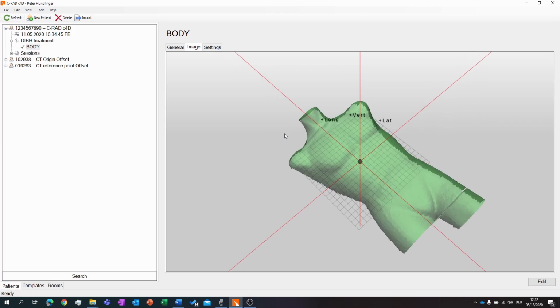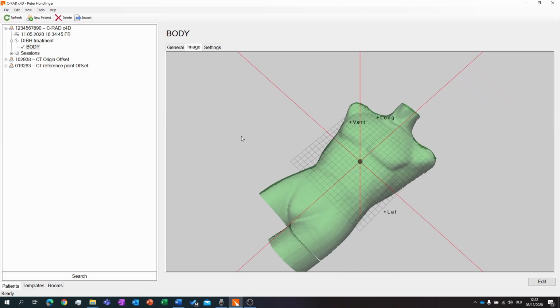Usually you use this for patient positioning, but as the setup mode in Catalyst is meant to be done in free breathing, we can use the Sentinel surface instead. However, both surfaces can be selected for C position, but the Sentinel surface will be selected by default. Also note that the TPS surface is for a deep inspiration breath hold case, not in free breathing.